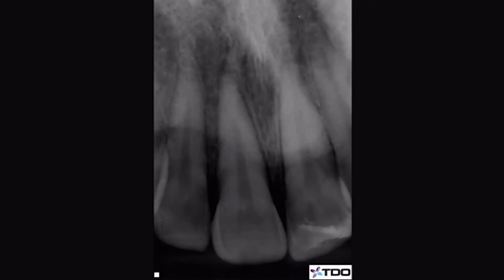Well, this patient presented shortly after a traumatic injury to the maxillary anterior teeth. You can clearly see a slightly widened PDL on tooth number 8 and radiolucent lines indicating possible fracture. It does not tell us the extent of the likely fracture and does not tell us if it is buccal or lingual. It does not tell us a lot of things because it is a two-dimensional picture of a three-dimensional object.